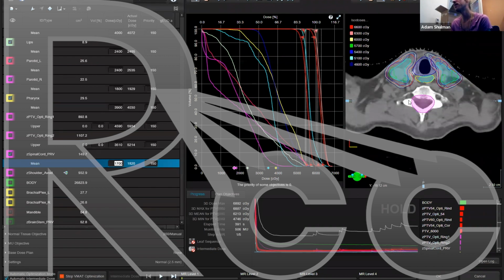We had a patient that we had to replan at our hospital before we implemented shoulder avoidance, where the shoulders dropped with weight loss, and we got probably a 5, 6, 7% increase in our PTV dose at that area. That was right where the brachial plexus was. We had to replan because the shoulders dropped and we had a lot more fluence going in, and we got an overdose of our brachial plexus. Usually at the shoulders, it's just these nodal volumes. They're so easy to cover without having all those degrees of freedom. It's best just to avoid the shoulders. Really good question, though.